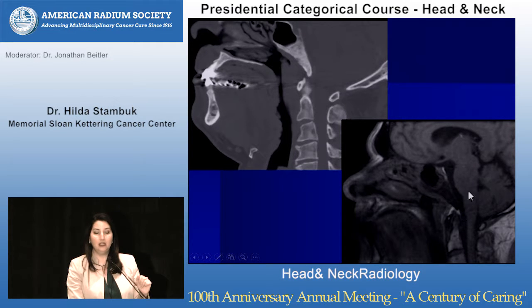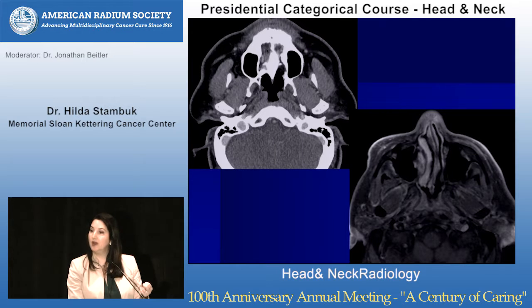If you don't believe it, look at the pre-contrast sagittal T1, look at the fatty marrow in C2 and C3, and in the clivus is completely replaced by tumor. Again, nasopharyngeal carcinoma, so where's the primary? If I look at the CT, I have to be honest, I have a little hard time with that, but the MRI is very, very compelling.